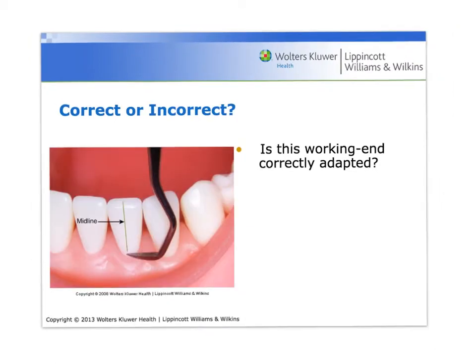Next, this slide can be seen on the same page. Is this correct or incorrect? And the answer is that it's correct. The working end is correctly adapted. Note that the middle and heel thirds of the working end are not in contact with the tooth surface. It's just that tip 1/3.